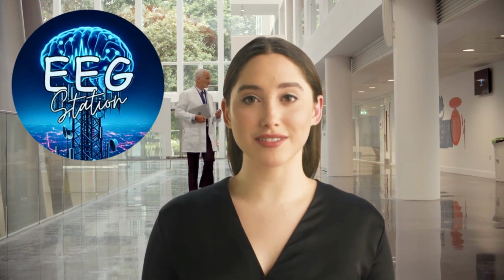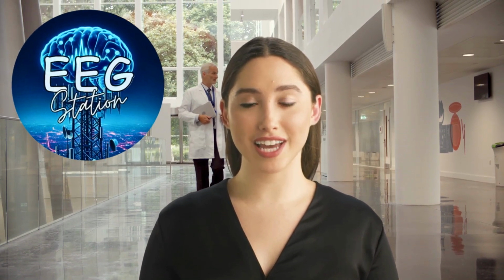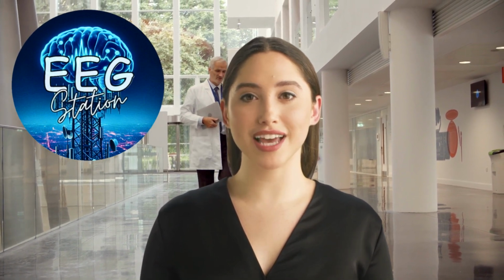Welcome to EEG Station. For this video, we will discuss the essentials of REM sleep as appreciated through the lens of the EEG.